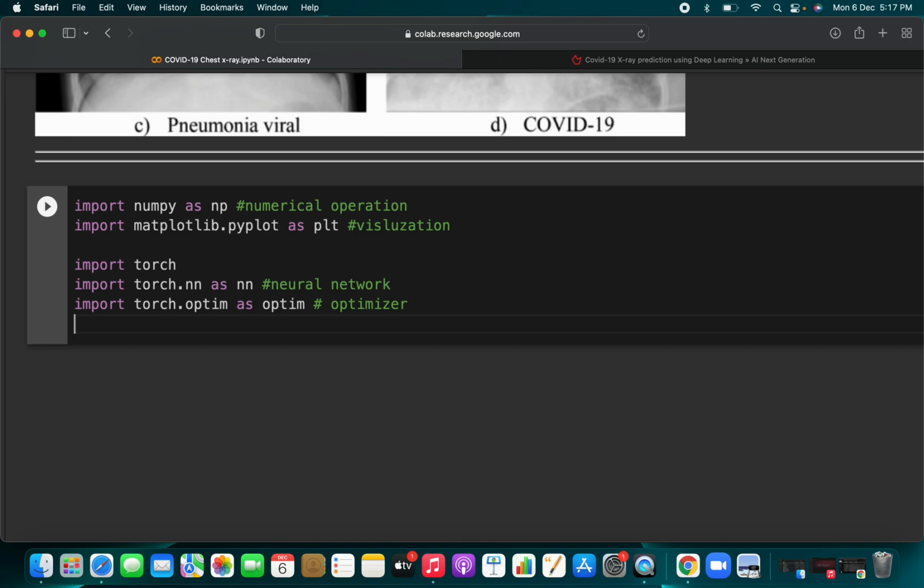So what do you mean by data loader? Even in the data loader you can read here also in the blocks, but here also I will explain you. Whenever you want to divide any data set into batches, because you can't pass everything, like 1 lakh, during the forward propagation and then again 1 lakh of data set during the back propagation to update the weights. So indirectly you are just giving a huge burden to the model, and it might not update the weights for that. Okay, so you are just dividing every data set into batches. We will see more when we do the coding part of the data loader.